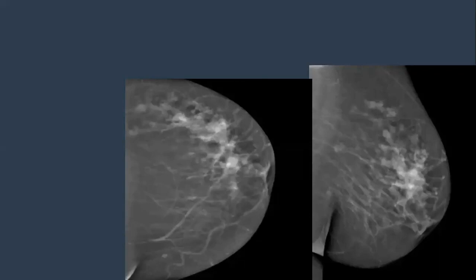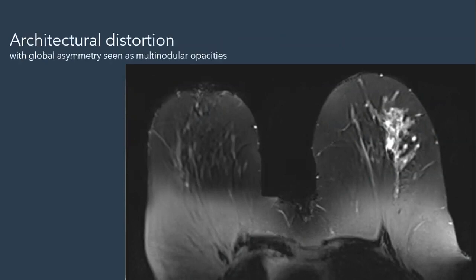Yes. MRI is done just to see the disease extent. But they had taken a biopsy under ultrasound guidance. Look at the MRI: the lesions are seen as segmental clumped enhancement following the area of multinodular asymmetries.